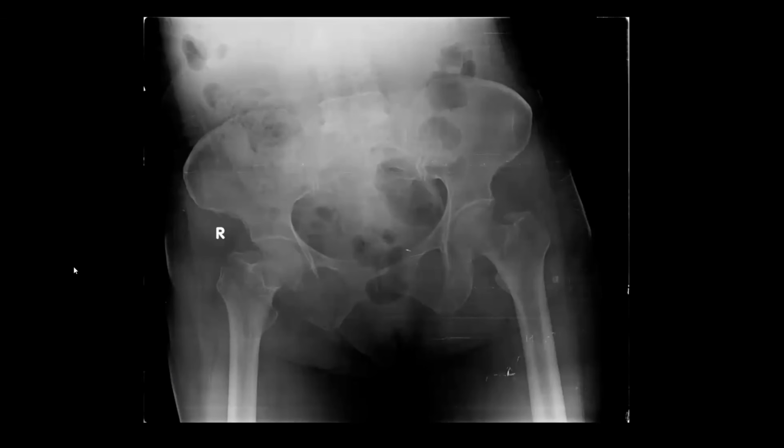Okay, so I'm presented with a frontal radiograph of the pelvis of a skeletally mature patient. You can see that there is an abnormality involving the right inferior pubic ramus in the form of a lucent or lytic lesion with cortical breach. The lesion shows a wide zone of transition associated with very subtle periosteal reaction. There is no internal matrix.